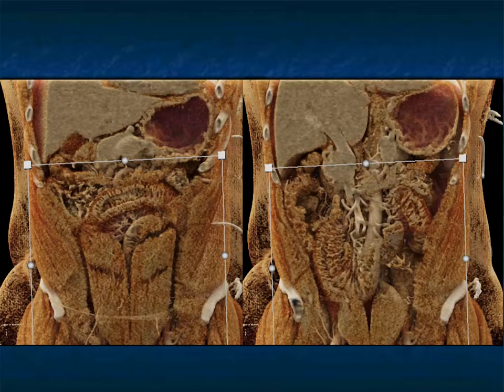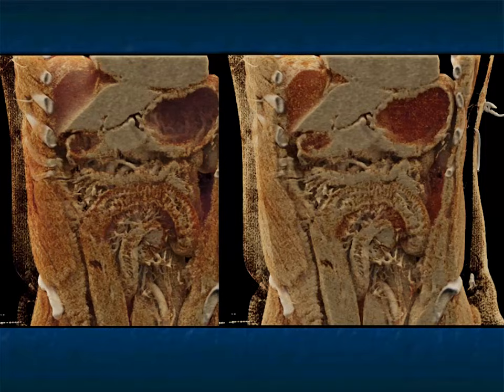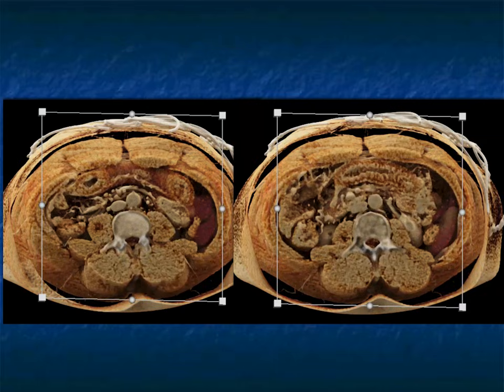Look how extensive the bowel is. Look at the edematous changes. Look at the fold thickening, the mucosal enhancement. Very, very prominent. Not exactly a pan small bowel involvement, but extensive involvement, a little bit of ascites, and rapid onset. So what are you thinking? Well, when you have rapid onset, you've got to think about infection. We spoke about in the last talk salmonella, and we spoke about MAI. But what about drug-induced problems?